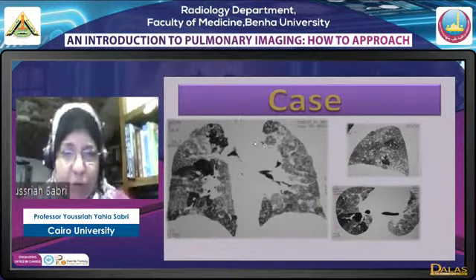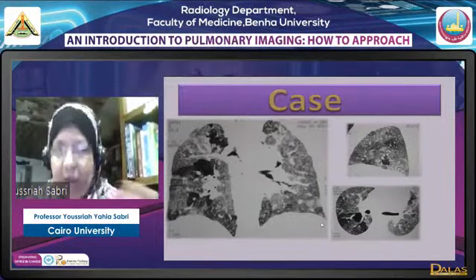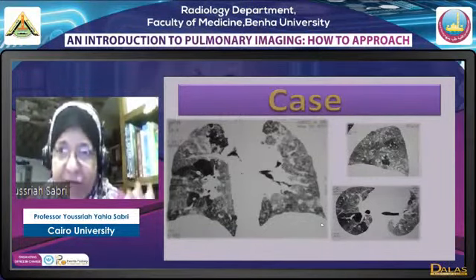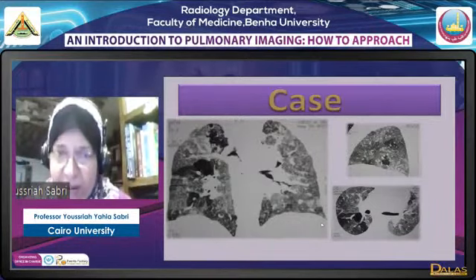With actually, if you look basally, there is relative sparing of the disease. This appearance is pathognomonic of subacute hypersensitivity pneumonitis. So, subacute hypersensitivity pneumonitis may appear as bilateral, diffuse, centrilobular ground glass nodules. This is, if you see it early.